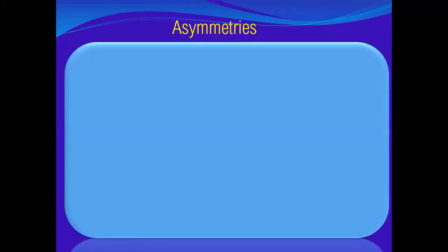Okay, so what is asymmetry? We described the mass. Now let us see what an asymmetry is.